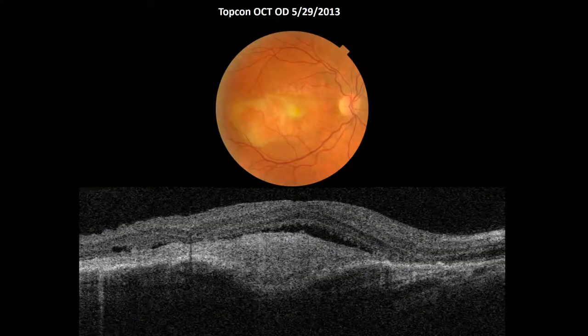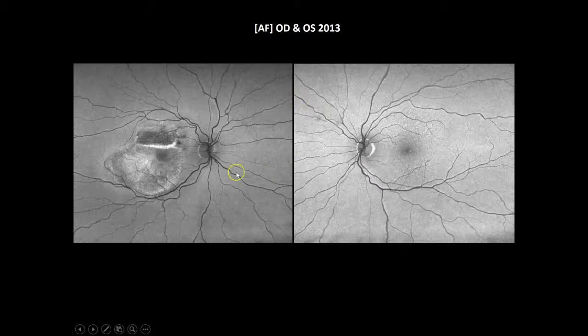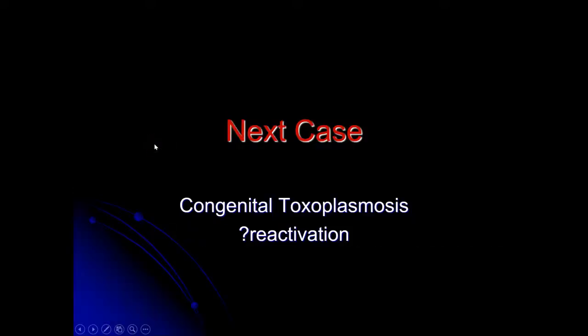Here's a patient of mine that had dry mac degen in both eyes, went on to wet macular degeneration, showed up a few months later. This is a fibroglial scar. There's some fluid still present, and you can see a small hemorrhage up here. We can look at it with autofluorescence, some drusen still in the left eye. This is still a dry eye. And here in the right eye, this actually looks like a fold. It's actually like a rip in the retinal pigment epithelium. When that folds on itself, it's hyperautofluorescent, as we can see here.